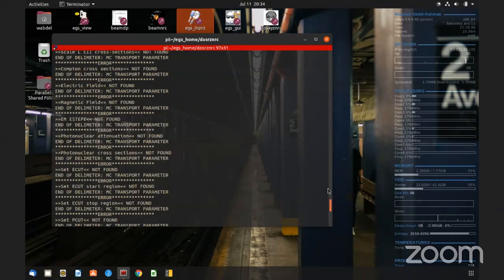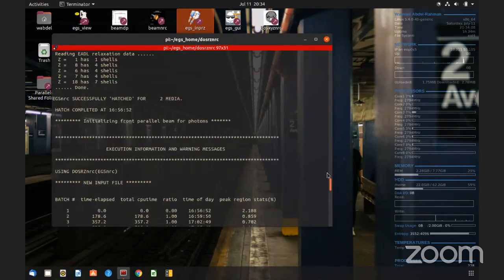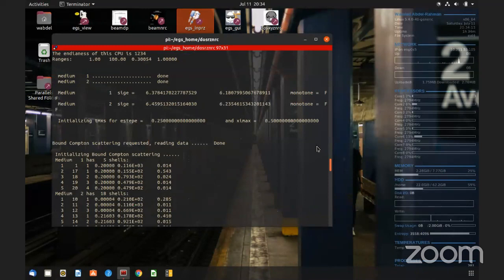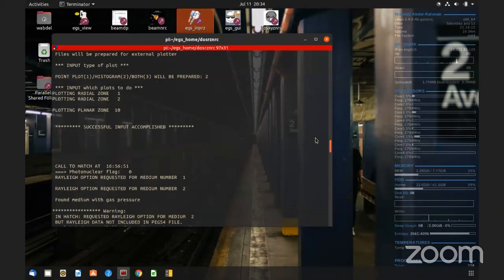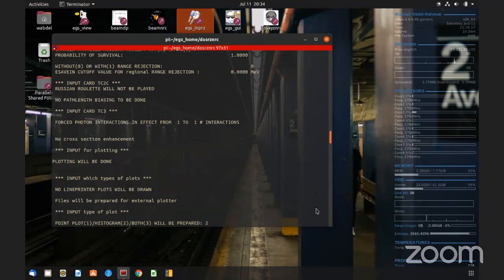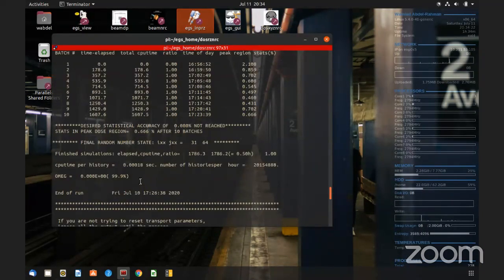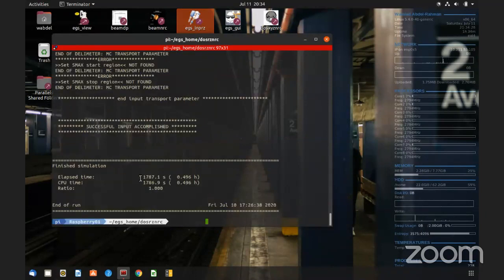Does it show here somewhere? I just want you to trust me on this. It's probably written somewhere. I've used 1 million histories. So 1 million histories ran in an elapsed time of about 1800 seconds. Roughly it's about half an hour.